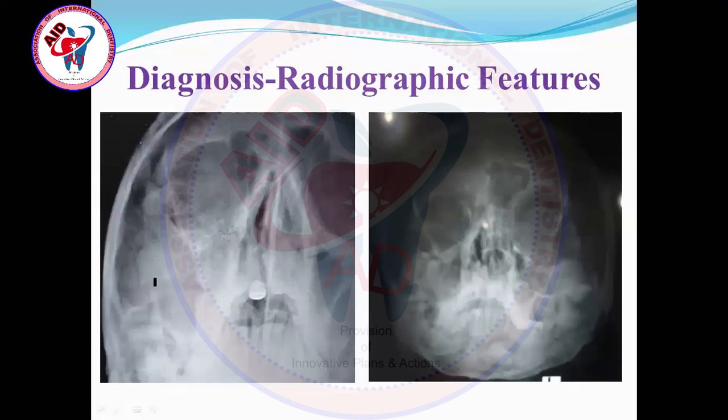there's discontinuity, and also there is a fracture line in the zygomatic arch. That is where the body of the zygomatic bone is joining with the zygomatic arch. There is a separation sign over there, and also at the lateral orbital margin and infraorbital arch, which signifies right zygomatic bone fracture. Here it is a tetrapod fracture. The body of the zygomatic bone is intact, but it gets fractured from its associated sutures.